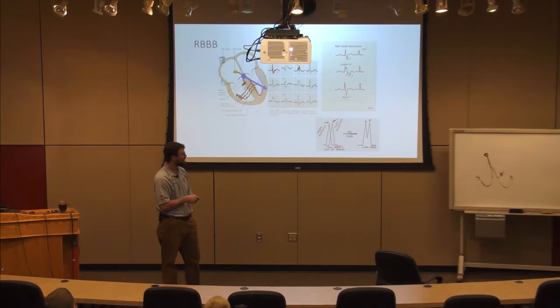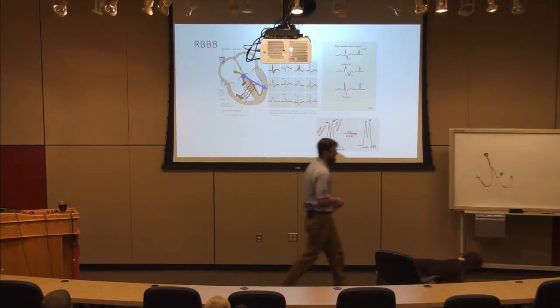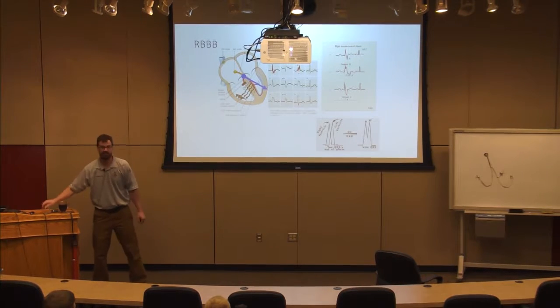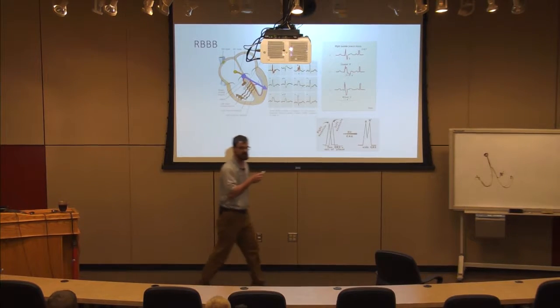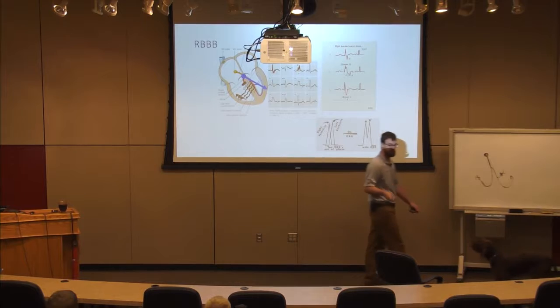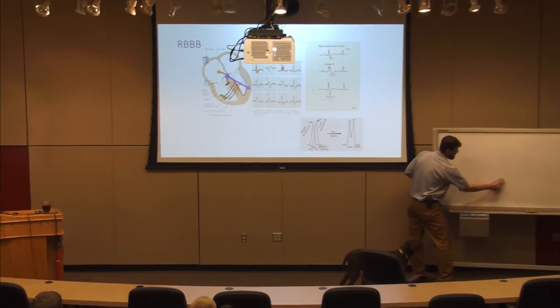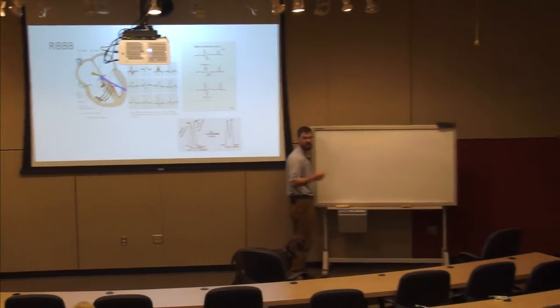So I have two events: a rapid fast event followed by a slow event. You can tell by the slope of that QRS where it's at. So one of the ways I can differentiate bundle branch block from tox or something purely ventricular in origin, like VTAC, is to look at that initial slope.